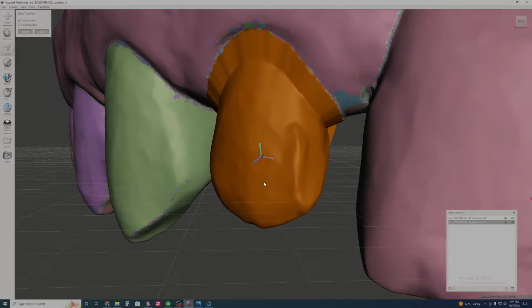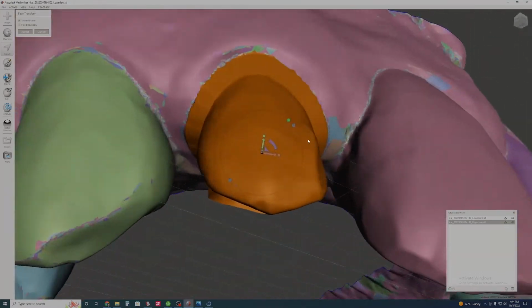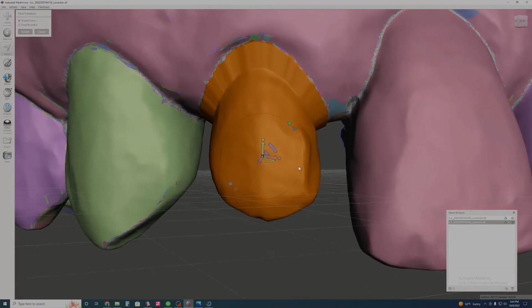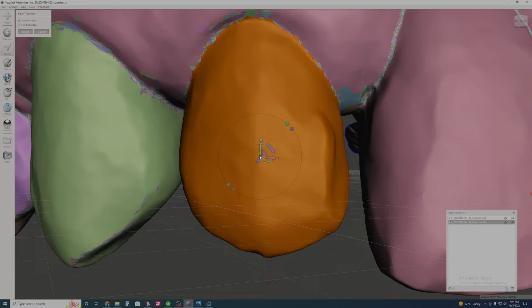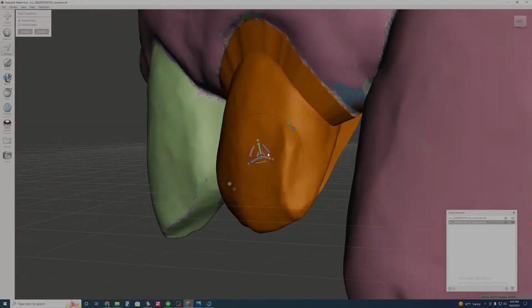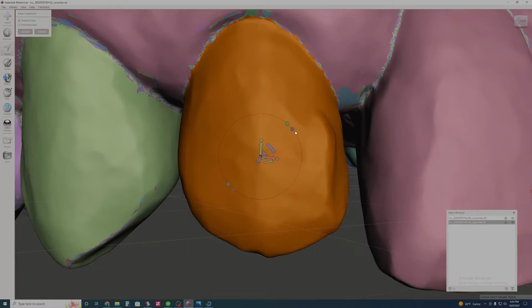And you can tell my tooth is kind of shrinking in size here. And you can kind of see a veneer prep happening. Usually I find that I'm going to hit Control Z here just so you can see the difference. I'm more aggressive in my preps on the incisal edge. So you know what? I'm going to hit something different here. I'm going to hit over here.